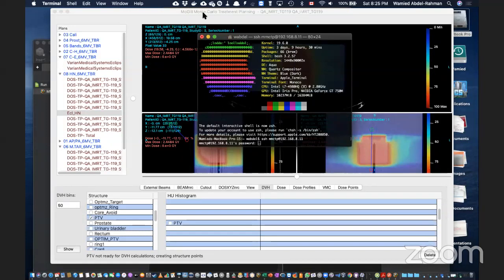This should make the calculation faster. These are called fast calculation techniques. Clinically, they're acceptable, but EGS, remember, is more accurate than others. So definitely the simulations are going to take a bit of time.